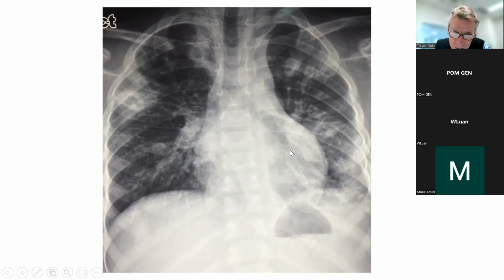main bronchus, and then it looks like there's a lot of patchy opacity around the left lower lobe bronchus, and it almost seems to open out. So there's a bit of dilatation of that bronchi. What might that be?